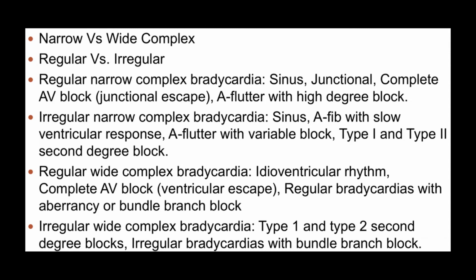Usually you don't see a lot of irregular wide complex bradycardias, but again, I usually instruct students to simply write out the algorithm branch point to help clue in on your differentials. And I think if you practice these over time, you'll learn to identify which diagnoses are associated with each branch point.